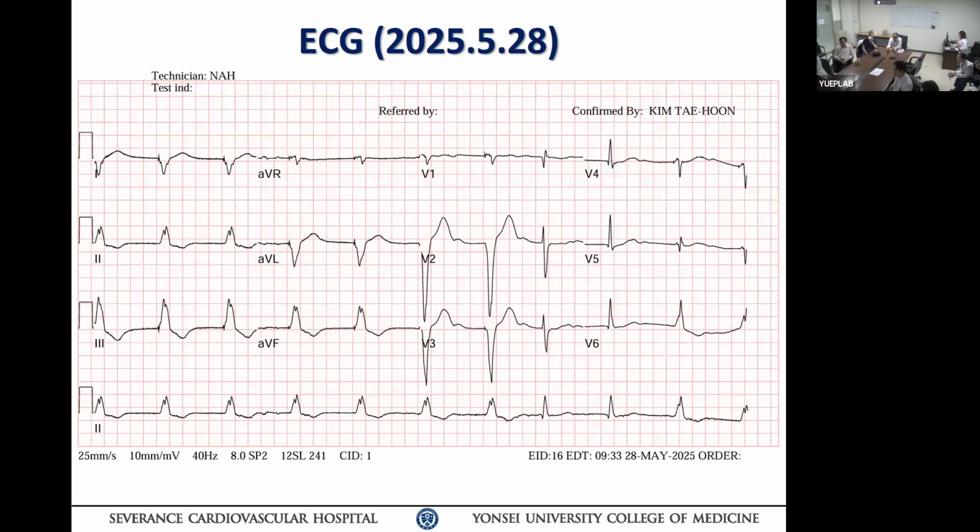This might be the patient's native complex, right? Yes. Next one, what? Native again. Native again, you think? Why is it a little different? Same, because this is a rate variation of the atrial fibrillation. You can see slight change in QRS amplitude and duration from time to time.